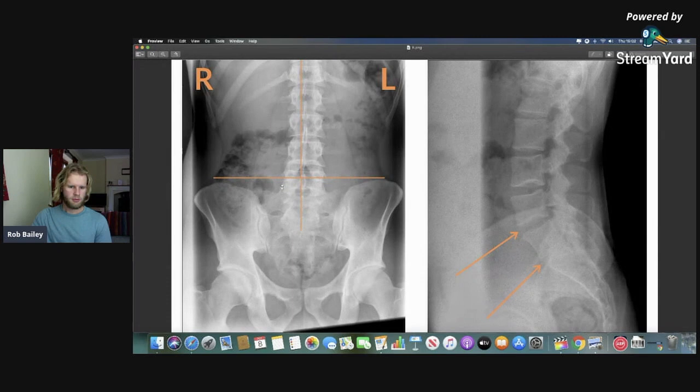If you follow this line as we go around here, it draws this shape around there. Usually that bone looks like these ones, like this one up here, where just a little bit sticks out the side. It's called a transverse process. But what's happened here is mine has gotten really big, and there's only a very, very small gap between the transverse process and S1. So it's likely that there might actually be some level of fusion or formation of a joint here, which is part of what we call a transitional segment.